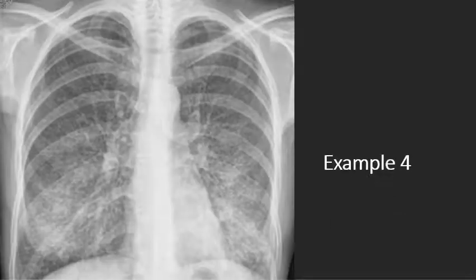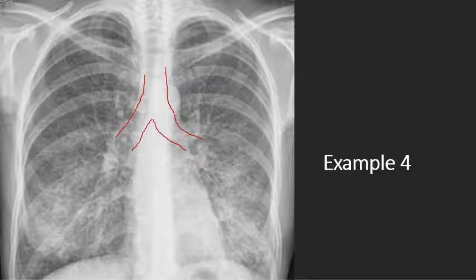So this right here is not very good either, and you notice it's different. It's not as coalesced as the previous X-ray we had before. It still is determined as ground glass appearance. And going with our ABCDE, as we follow down the paratracheal stripe right here, there is our airway. Here's the carina, it's midline.